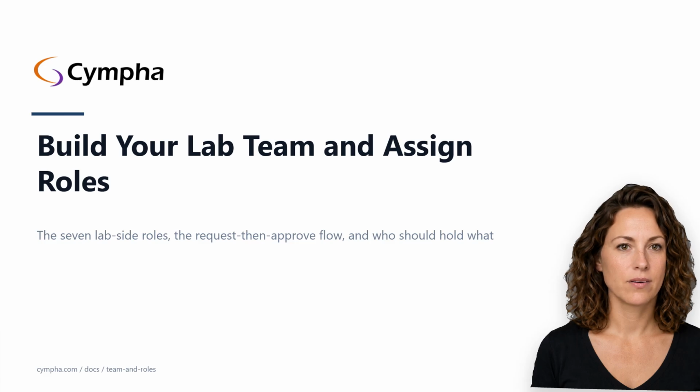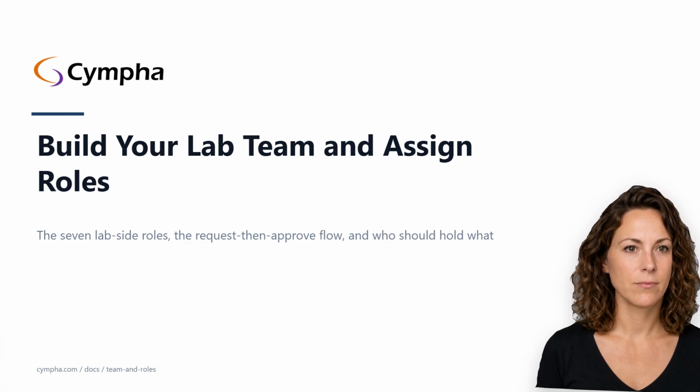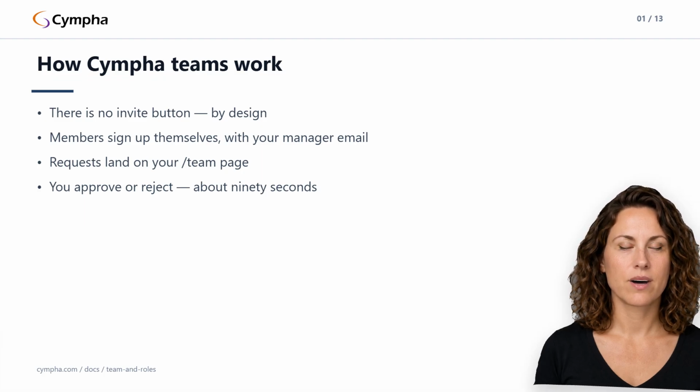Before any role talk, one mental model to install, because it's the thing every new lab manager looks for and doesn't find. There is no invite by email button on Cympha. Anywhere. The team flow runs the other way: request, then approve. Your future team member signs up for their own account, points it at your lab using your manager email, and picks a role. Their request lands on your team page, and you approve or reject it.